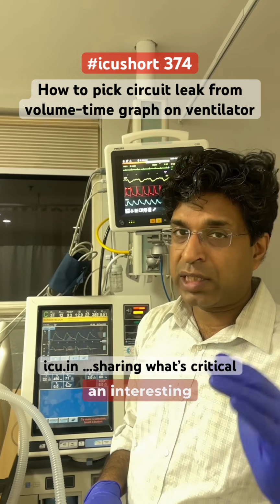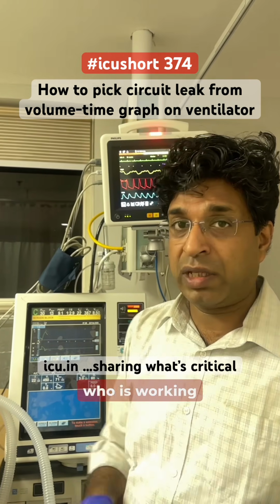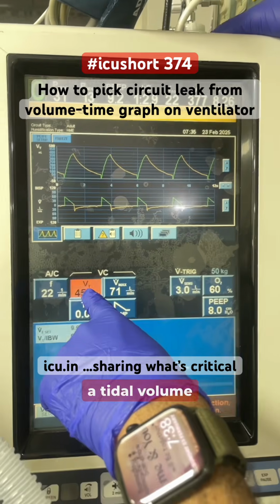Okay, I want to show an interesting phenomenon on the ventilator, and especially everybody should know this, especially the nursing staff who are working on the ventilator. So this is a volume control mode, and we have set a tidal volume of 450.